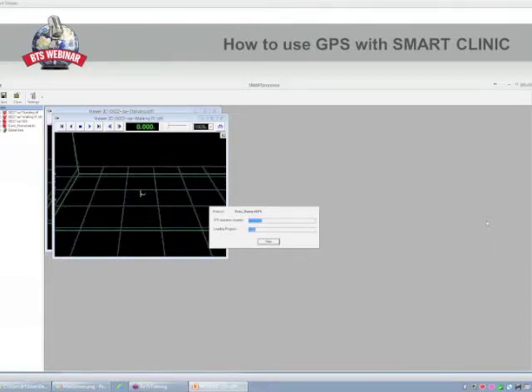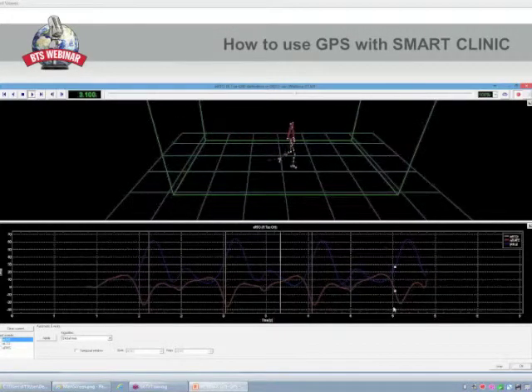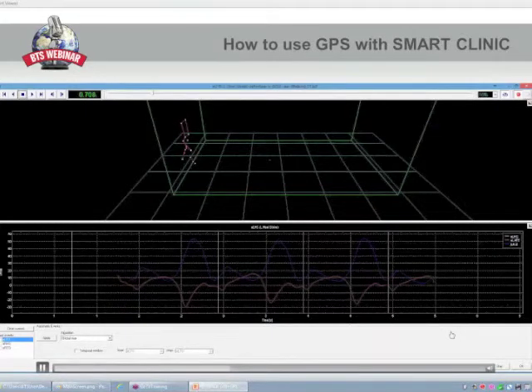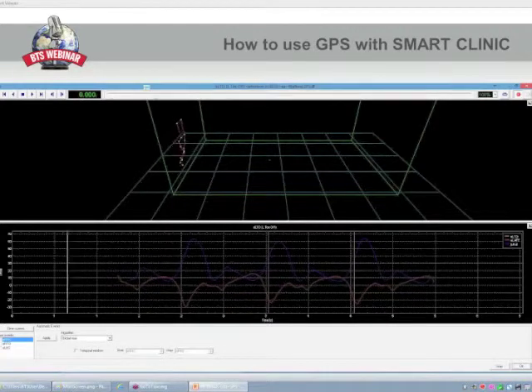Okay, so now the next step will be to define the events of the gait cycle, but we already did it during the previous processing. So as you can see, the events have been already defined. What we have to do is just check that they are fine, and that we agree with the identification of the desired events. Okay, so now this is the left foot strike. Okay, we can pass over. The next one will be the definition of the left toe off.